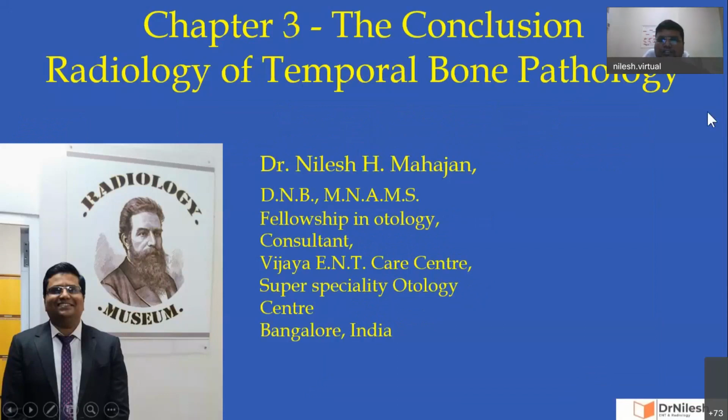So, sir, today is the second talk and the last talk. We'll move ahead with chapter 3. Yesterday, we saw two chapters, the beginning and journey through the temporal bone. The third chapter is the conclusion, that is radiology of the temporal bone pathology.